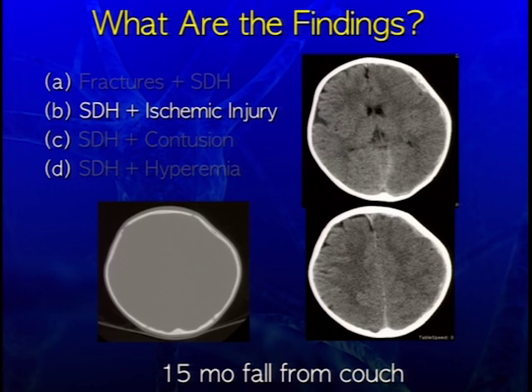This is, again, very similar and building on what Gary mentioned earlier. We see the subdural collection, a little bit heterogeneous, but in our experience, as Gary mentioned, when you see it associated with ischemic injury, it's most often acute in nature. Now, this ischemic injury can be very subtle. If you look at the right, you can see the sulci well-defined and the gray-white boundary nicely outlined in the right frontal lobe, compared to the left frontal lobe, where the subarachnoid space and sulci are effaced, and you can no longer see that linear band of the cortex.